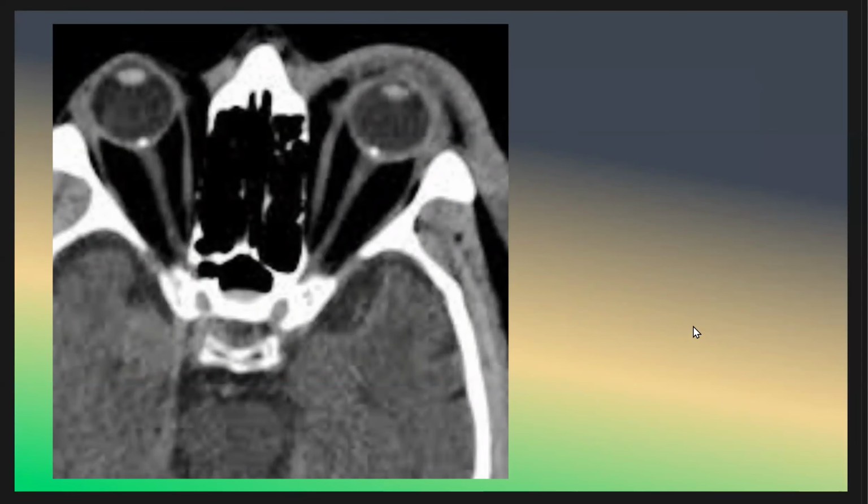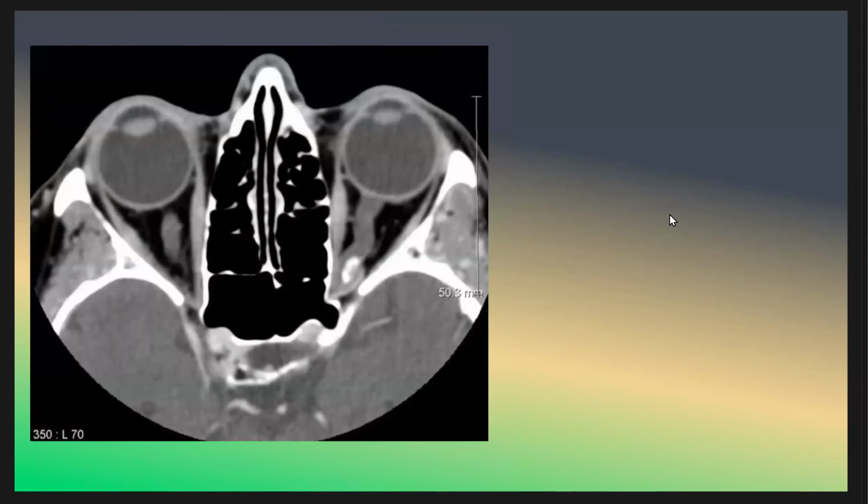What do you think the patient has? Okay, we have bilateral calcification as we see here, and this is a classic optic drusen. It is a classic optic drusen. Okay, what do you think the patient has here?